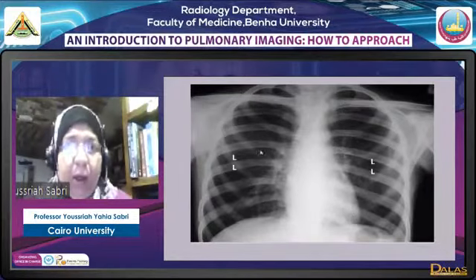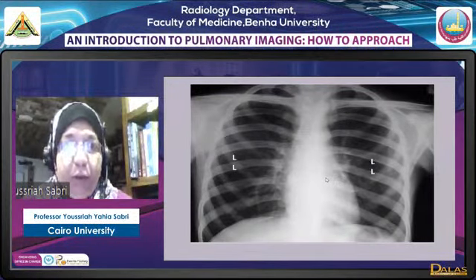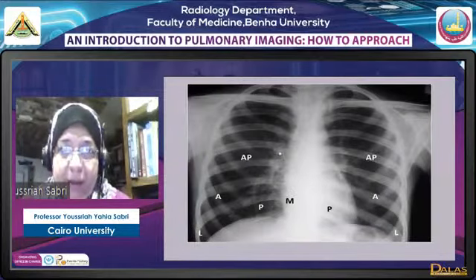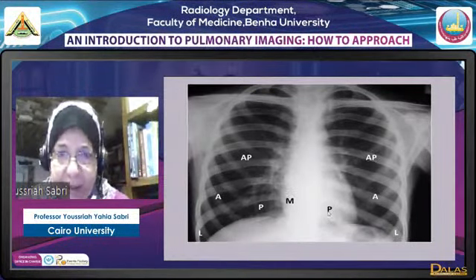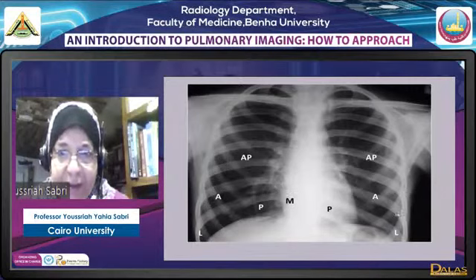As for the lower lobe, the lower lobe is posterior in these structures, but of course in the chest X-ray they are superimposed. We have the apical segment of the lower lobe nearly at the level of the hilum on both sides. The lateral basal segment is in the costophrenic angle. We have the azygoesophageal recess, and the medial basal segment, which will be mostly below and behind the heart, while on the left side behind the heart we have the posterior basal segment. The posterior basal segment of the right lower lobe is beside the medial basal here, and the rest of the lower lobe is mostly this anterior basal segment.